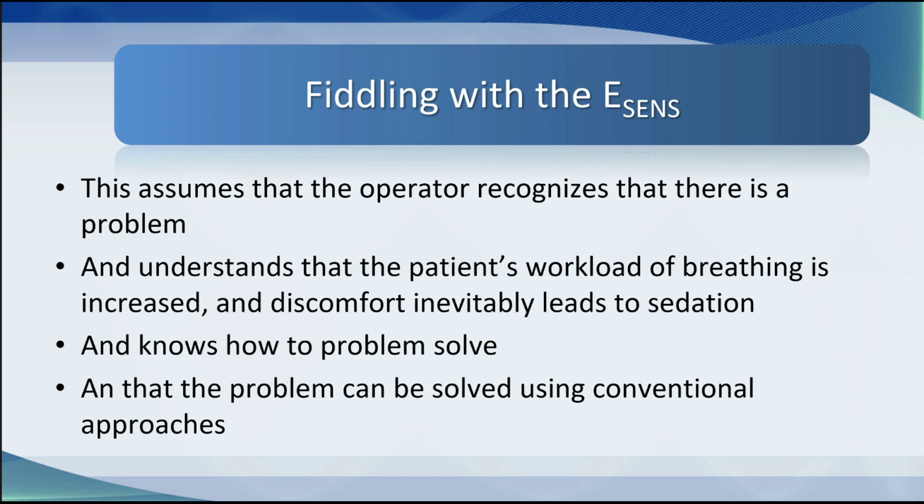You need to be able to problem solve ventilator waveforms, and most of these problems can be resolved with conventional approaches. Nevertheless, this concept of expiratory sensitivity is problematic because it assumes you know what the patient is trying to do. You need to know when the patient is trying to start a breath, and you need to know when the patient is beginning to finish a breath. And that's not easy to determine by just standing looking at the ventilator.